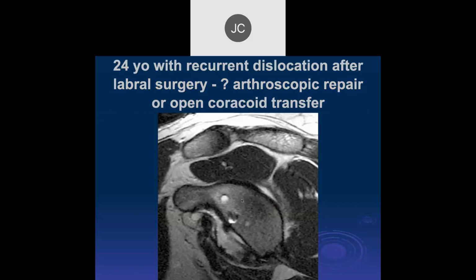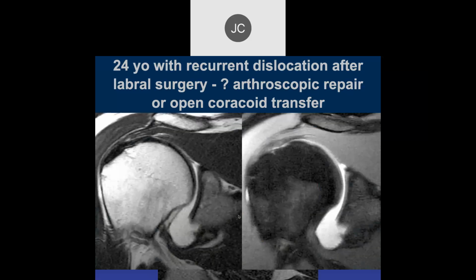Nowadays, what we would do is a perfect circle. We'd determine the percent involvement of the bone, like we talked about in the last lecture. And we would also determine whether this is an on-track or off-track lesion. Then that would put us into the decision-making algorithm that we talked about at the end of last lecture and the beginning of this lecture.